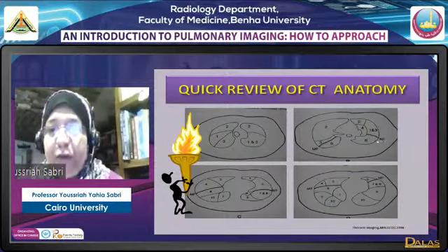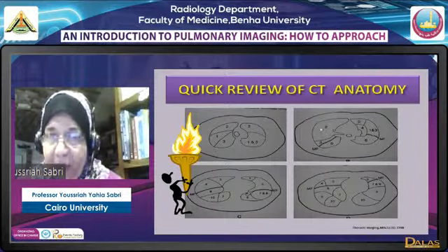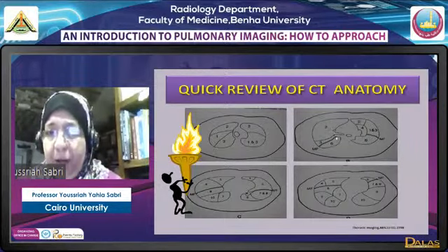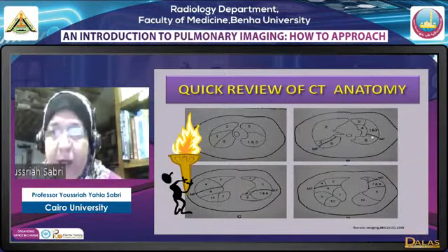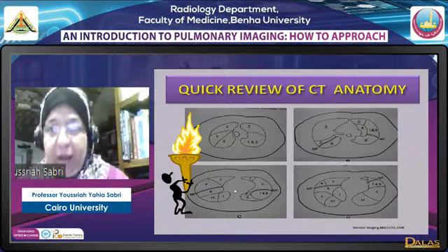Once we have the major fissure, بقى عندنا apical of lower on both sides. Once we have apical of lower, we no more have apical of upper. هيبقى عندنا anterior, posterior, major fissure and apical of lower، وهنا anterior وهو السيجمنت هنا اسمها apico-posterior. تمام. وبعدين apical of lower. خلصنا الاير واي، يبقى خلصنا الابر لوبس.